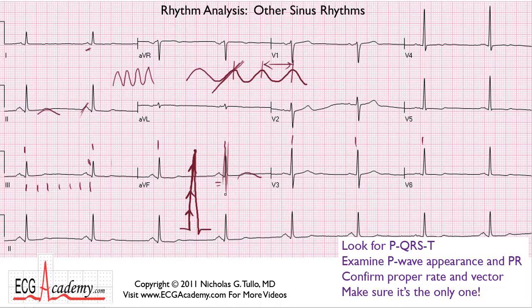the quickest, most rapid voltage change. P waves have less higher frequency deflections, but they're certainly faster and sharper and spikier than T waves. So what I always tell people is when you're looking for a P wave, you have to look for a sharp deflection. T waves tend to be nice and smooth, but if there was a P wave superimposed on that T wave, then you'd wind up having a signal that kind of looks like that.